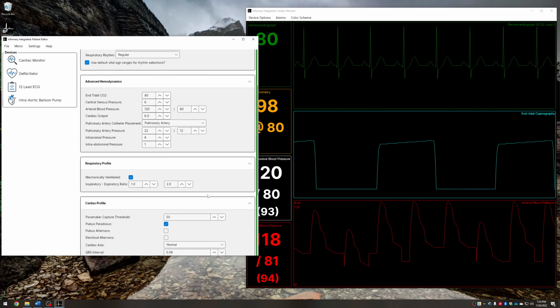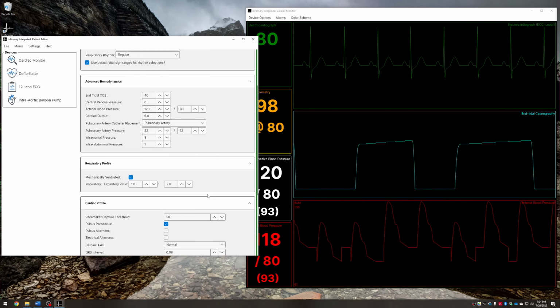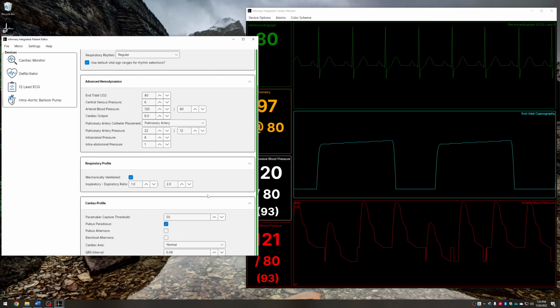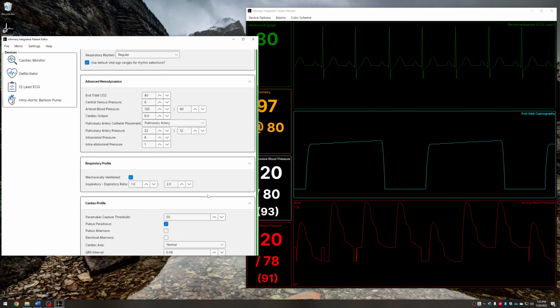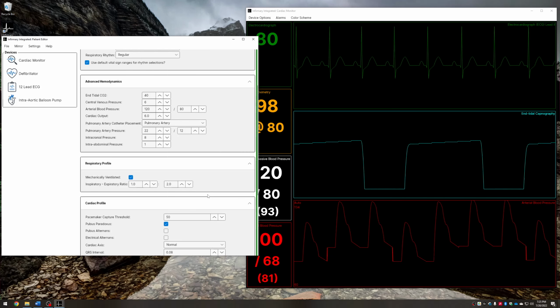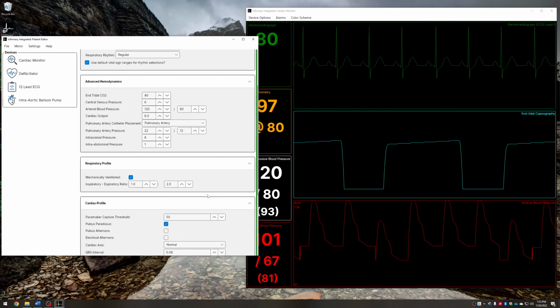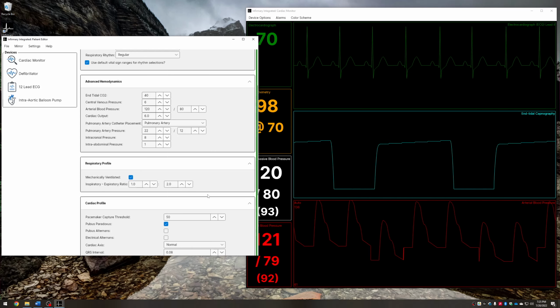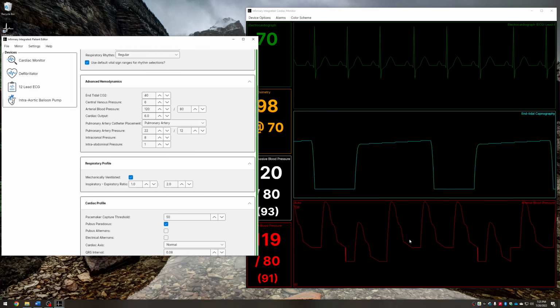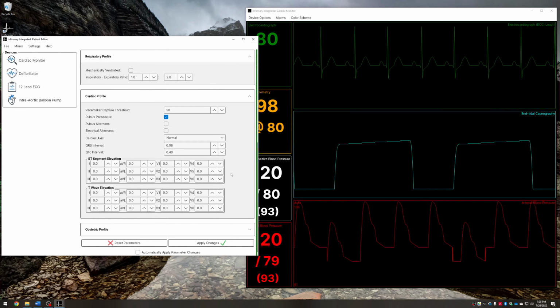So what we're going to see is, now that we've mechanically ventilated this patient, inspirations are going to increase intrathoracic pressure, which is going to flip the pulsus paradoxus, because mechanically ventilated patients have higher intrathoracic pressure on inspiration, whereas for naturally ventilated patients, that's the opposite. So that does factor into some of the calculations behind the scenes that Infirmary Integrated is making.